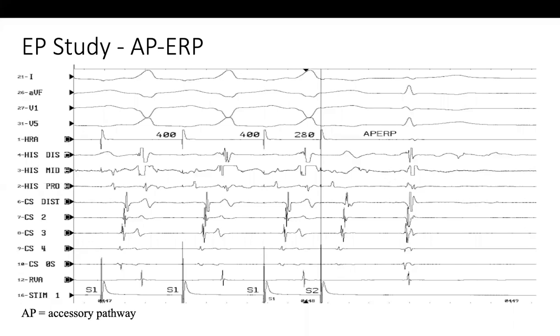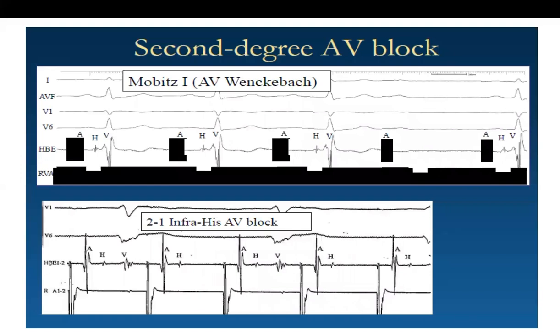Okay. Thank you. I think we have seen this one before. This is very important for the exam. Okay, Doctor, the answer, but let us take somebody to explain to us. Anyone can comment.